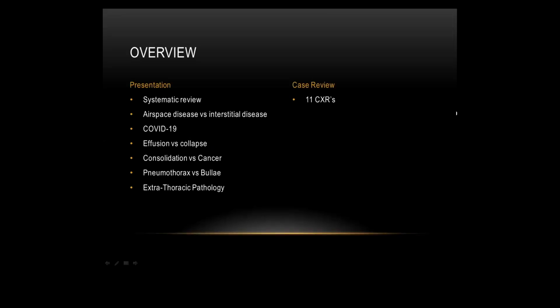So what I'm going to do today is give you a presentation on chest x-rays, how to interpret them, and what to be looking for in chest x-rays. I want to give you my system of looking at a chest x-ray.